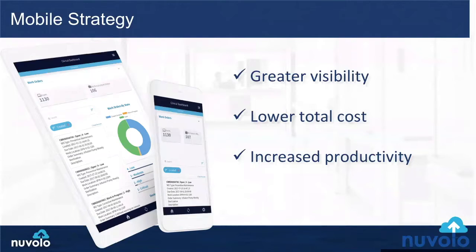So lack of data reliability, but also we're talking about not getting to it until the end of the week. In some cases, maybe we're also talking about timeliness. So we don't actually have relevant data anymore because it's only as relevant as how old it is. So helping business units to make better decisions because now we're collecting data at the point of service through the mobile app.